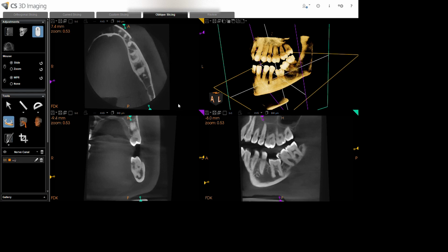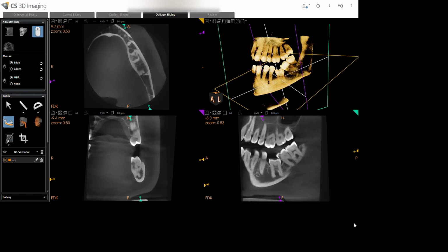Now if we move on further, we keep on moving. So what is happening, this resorption is actually extending to the furcal floor here. Okay, this resorption is extending up to the furcal floor. So you can say that it perforates the pulpal floor.